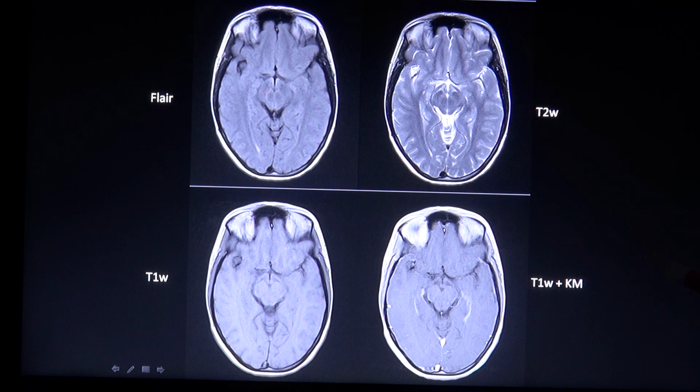This video shall give you a basic knowledge about the most commonly used MRI sequences. I don't want to talk so much about the technical details, but instead focus on how to recognize a certain sequence and also what information this sequence can give you regarding image interpretation.